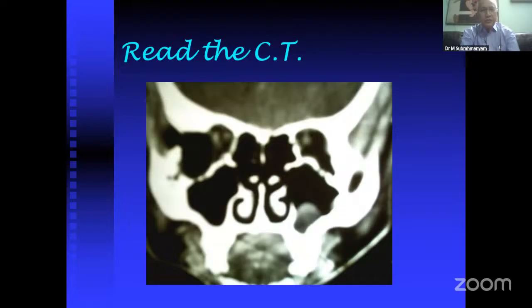I'll give half a minute. I want to see whether people can read this CT and tell me what it is. Do we get the feedback? No, we don't get.